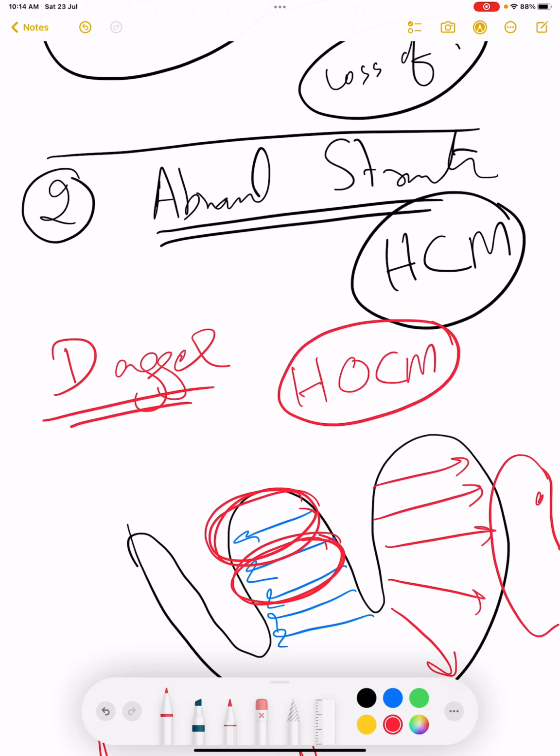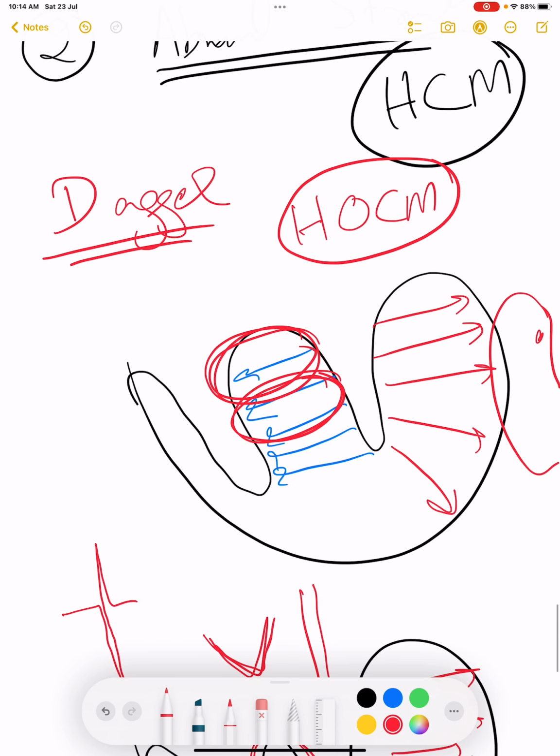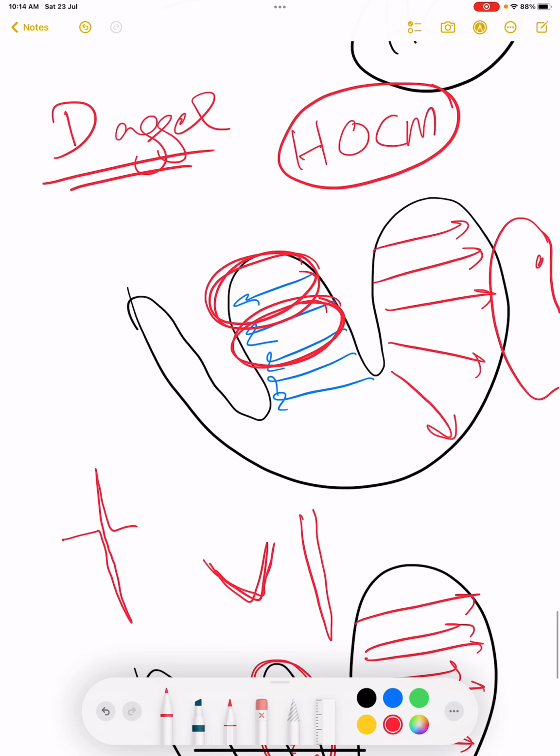Because in hypertrophic obstructive cardiomyopathy there will be enlarged hypertrophy of the septum, which can sometimes cause obstruction in the outflow tract. So if we see a very deep Q wave, deeper than 2 millimeters, which is not wide, dagger shaped, sharp like a knife, this will be a pathognomonic finding in the ECG of hypertrophic obstructive cardiomyopathy.